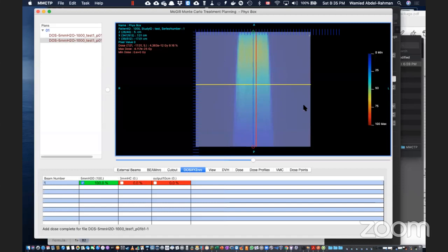The discussions today, because I really wanted to know step by step how to create the water phantom and do this. Yeah, I think this is very important. I was struggling with it personally. I managed to get DICOM files, but for those who cannot get DICOM files, you can make just a water phantom and do simulations. If you are testing, for example, a beam model, you could do it from the XYZ files. You remember we were using those XYZ and then stat to extract the profiles.